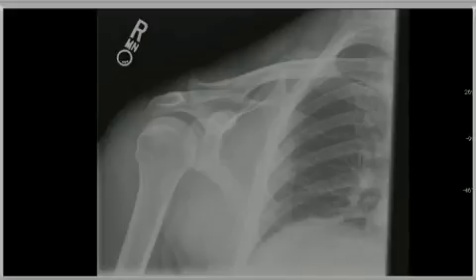In this module, we will review the basic radiography of the shoulder, including 4 projections. This is the standard frontal or AP projection, in which case we see the standard 3 main bones of the shoulder girdle: the scapula, the humerus with humeral head, and the distal clavicle.